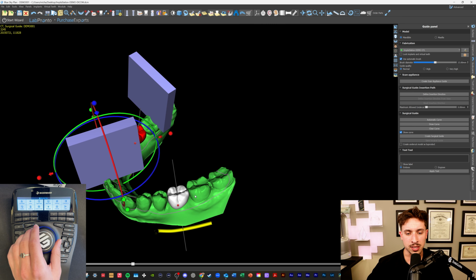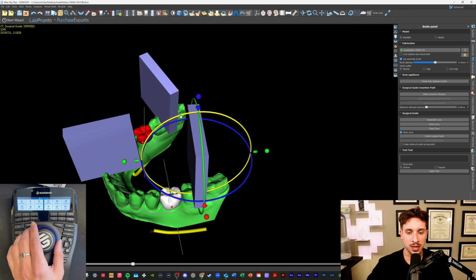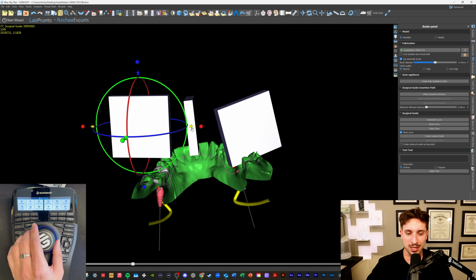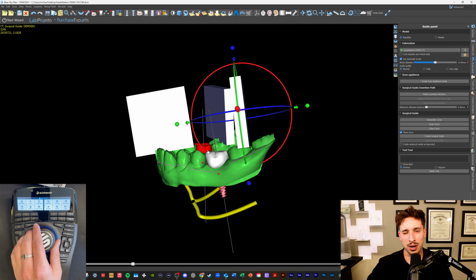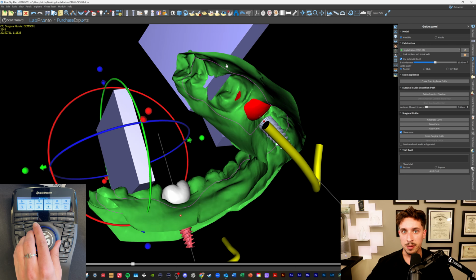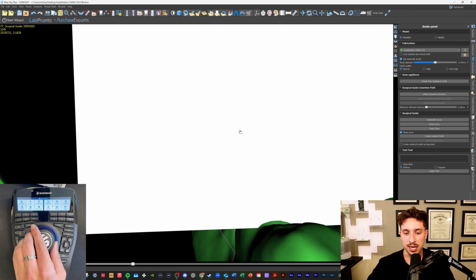You'll see when this goes and actually generates the surgical guide that it will generally put a couple windows just right on the adjacent teeth to it. But I do always like to add more verification windows than you think is totally necessary, just because, like I said, if you don't have this guide fully seated at all times, I would actually postulate that it's more dangerous than doing this freehand, because you have something in your hands that you think is accurate, that you think you're placing these implants in this specific area, but if it's not fully seated, then you're not. So you have this false confidence that can lead to a lot more issues.